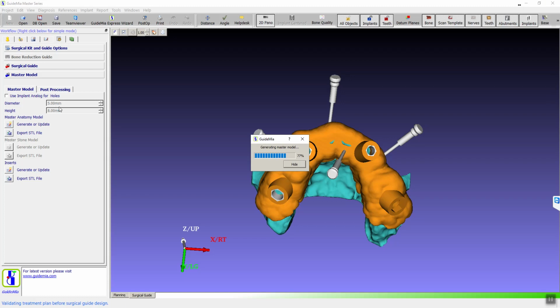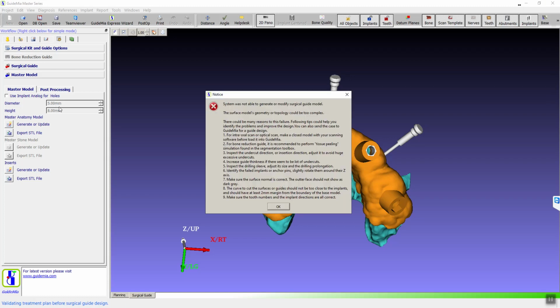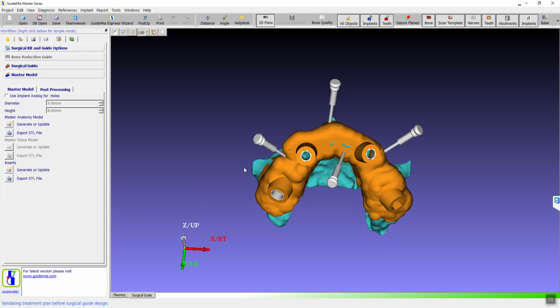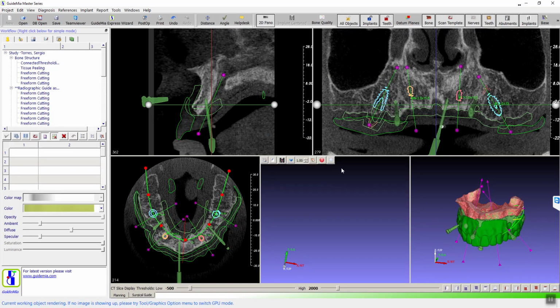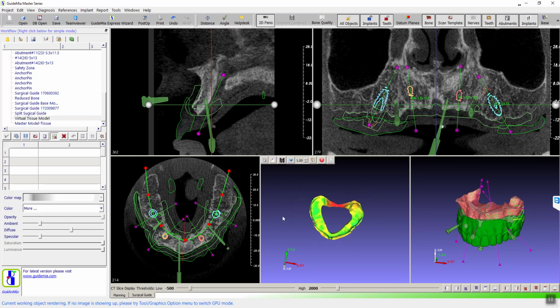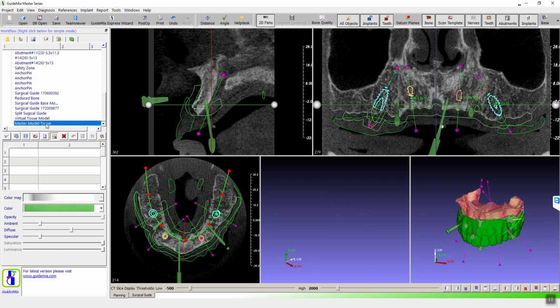Why would we want that? Some people want to print the tissue model for them to investigate or to play in the lab. Yeah, I guess this is.